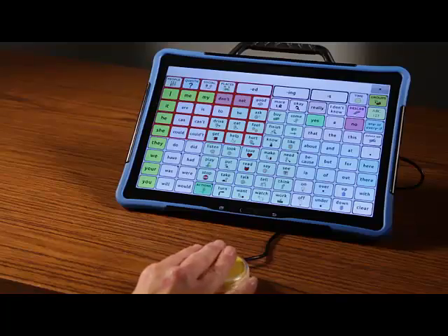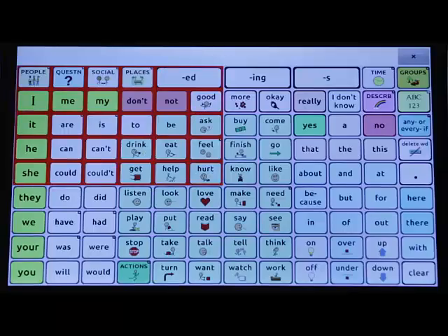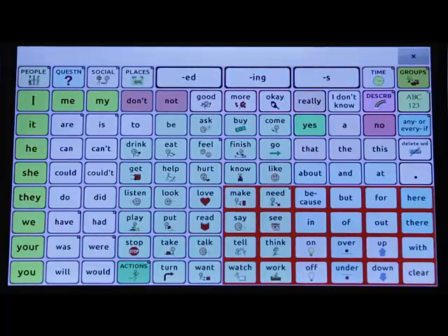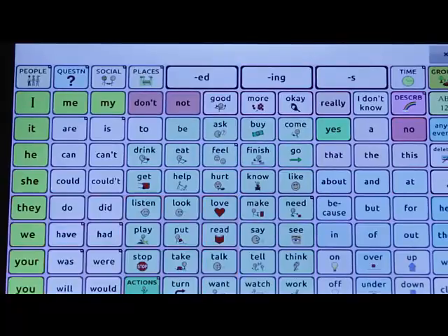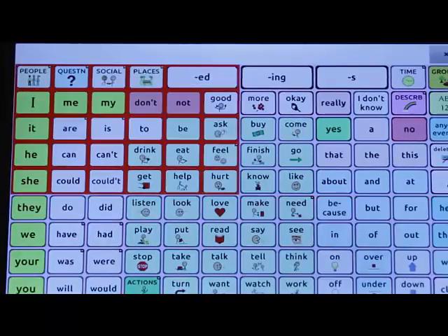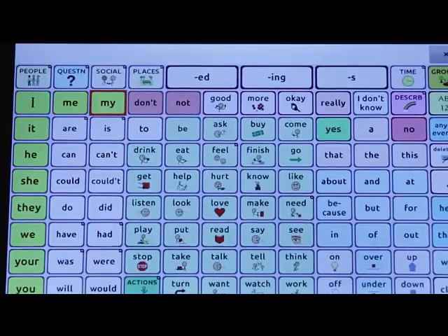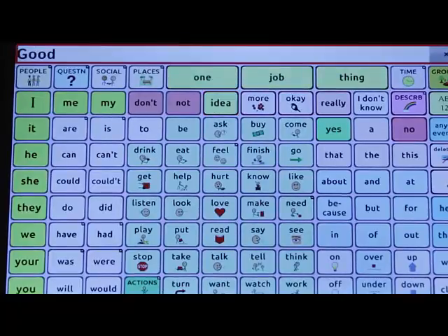Items in the grid are divided into blocks of buttons. They might be 3 by 4 or 6 by 5, or however you decide to arrange them. The blocks are indicated one at a time. When the block containing the desired item is highlighted, the user presses a switch. Typically, the highlight then moves through the block with a row column pattern, button by button, until they get to the desired item, and the user hits the switch to select at each level.